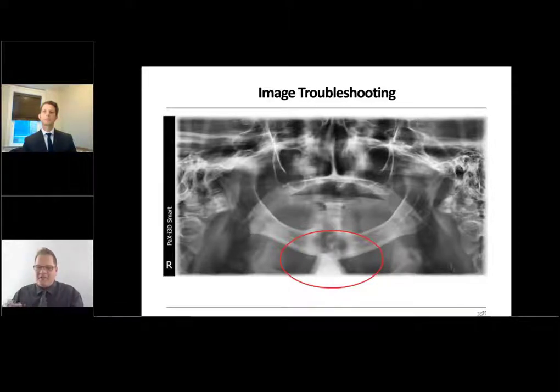So what happens usually, depending on what kind of radiation blockage vest you're using, is it slips up on the back of the neck, and the back of the neck is round, so it forms a V, and that's what that is there. Right, I always say have the vest high in the front and lower open in the back, because we are shooting posterior to anterior when we're taking our images here. So that's where the lead apron ran up too high in the back of the patient there.